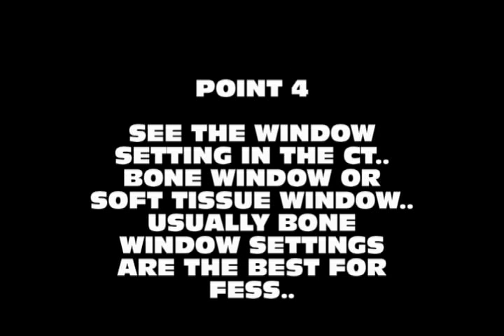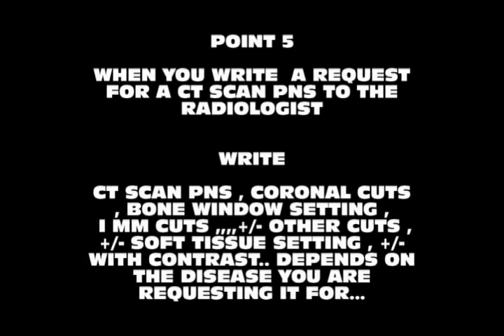Point number 4, see the window setting in the CT, bone window or soft tissue window. Usually bone window settings are the best for FES surgery.